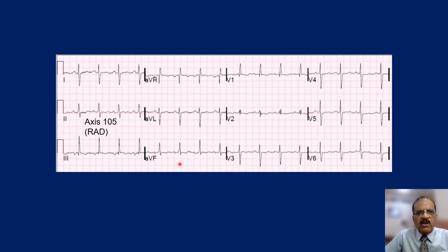Now, this is another ECG. Let's see what is the diagnosis here.